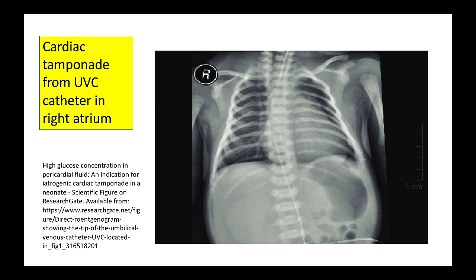So it's not like the catheter has to actually poke through a hole in the wall to cause a life-threatening pericardial effusion. And that's exactly what happened here in this case report. Fluid collected in the space around the heart and caused heart failure. So that needed to be tapped. So take these lines very seriously and their position very seriously.